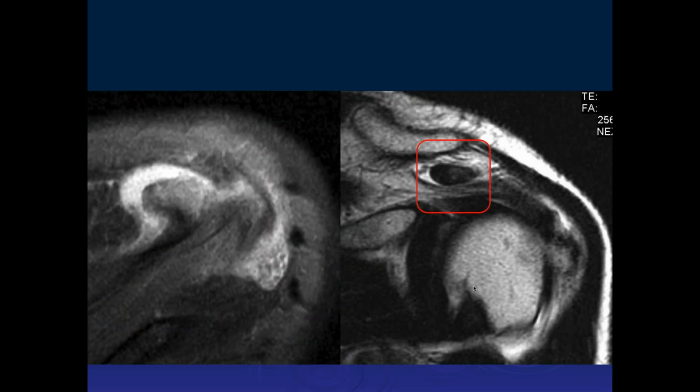Okay. Pablo, what do you think of this case? So it's a T2 sagittal image. Let's see. Looks like I don't see very well the supraspinatus muscle. I see what I think is the little anterior. Okay, I see. That's okay, and I see some fluid in the subacromial subdeltoid bursa, and there's a focus that is hypointense. Well, it could be blood, I guess, or it could be also a calcification.